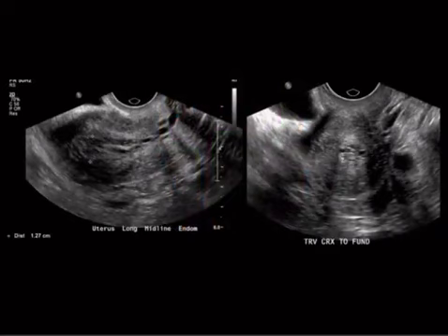So next case here, ultrasound, and what we've got is a pretty thick endometrium. We've got calipers on stuff. Remember, I've sort of touched on this a few times before. How do you know it's too thick? Because it has calipers on it. As a general rule for multimodalities with regard to multiple choice, when you see calipers on something, I would just assume that it's either too big or too small.